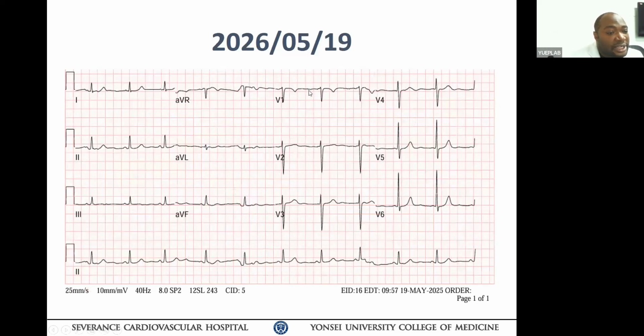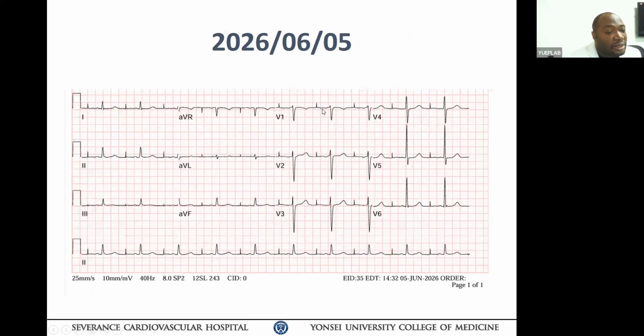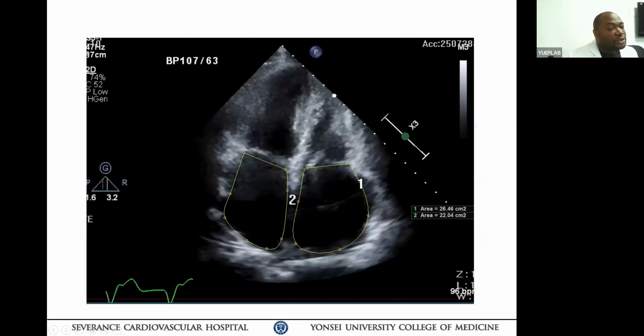We see it again here in the 2026 ECG. Here it's actually a bit more prominent. And then once the pacemaker was put in, it stood out much more. So this was in 2022 and then in 2026. So this is just showing.